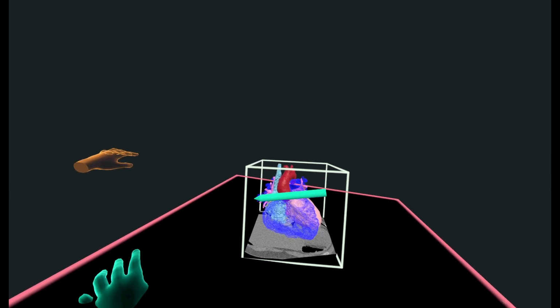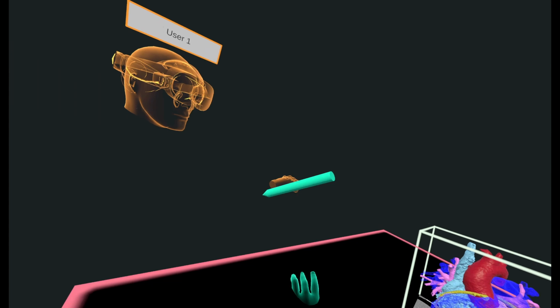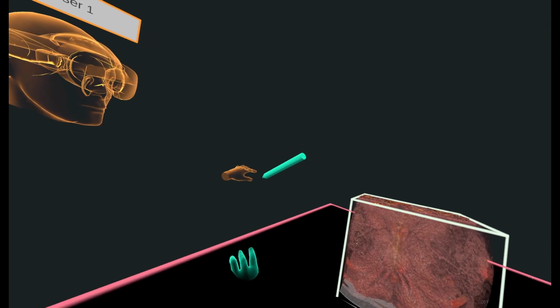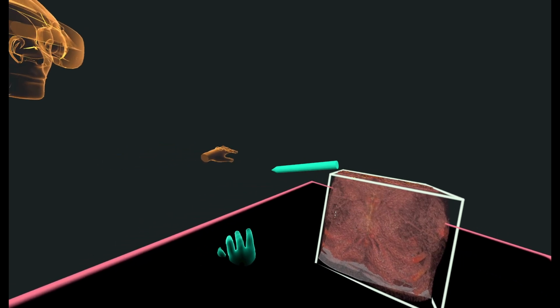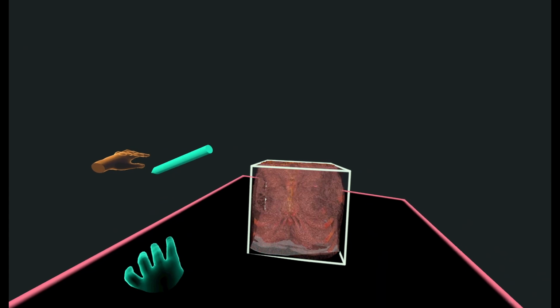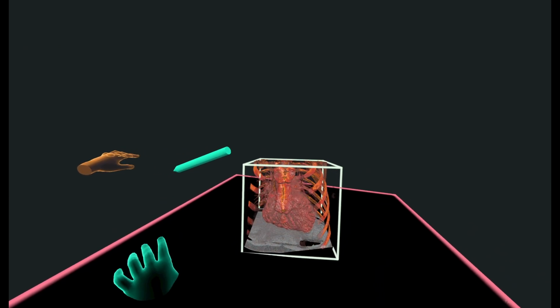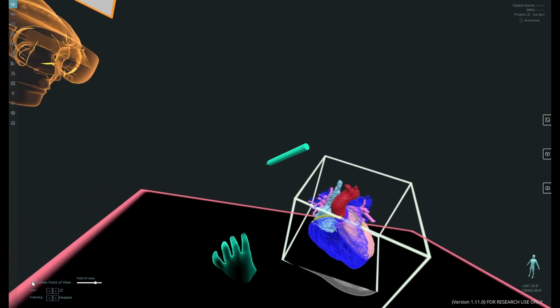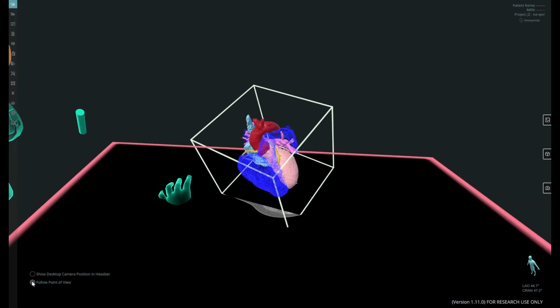structure and go to a volumetric rendering. It's going to show us the actual anatomy of the heart with the volumetric as we have been doing in other demonstrations, which is a very quick segmentation. We can have our echo embedded into this 3D reconstruction.